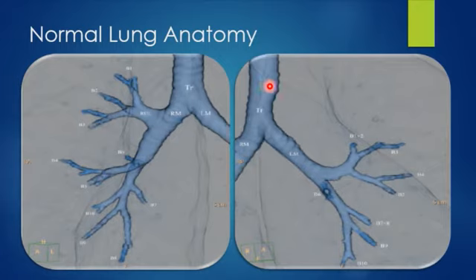Sometimes there will be narrowing of the coronal diameter of the trachea, causing the coronal to sagittal ratio, which is normally 0.6 to 1, to be less. Once it is less than 0.6, it is called a saber sheath trachea. 0.6, not millimeter, just 0.6 ratio. Yes, sorry.